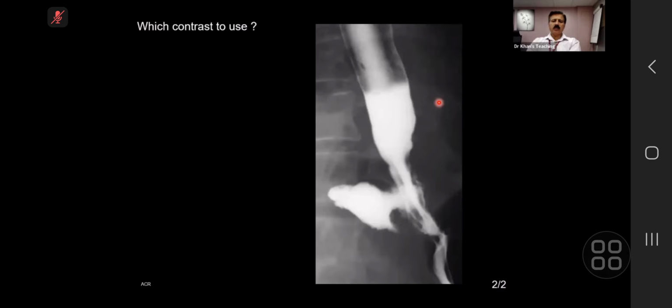But many times the surgeons want a bit of anatomy. Can you please outline where the tear is, upper or middle or whatever. So a viva question, which I'll ask you, number 11: what kind of contrast will you use? I would use a low osmolality contrast medium. Excellent. So that's the correct answer.